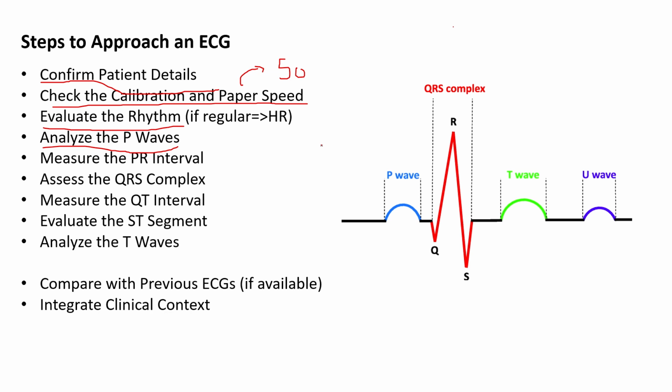For example, if P wave is present and the rhythm is normal, you can immediately say this patient is in normal sinus rhythm. And let's take the opposite of it. If there are no P waves and the rhythm is irregular, and we call it irregularly irregular, you can say it's atrial fibrillation, and it will turn out to be right. So you can already make a step into advanced ECG from understanding the basics.